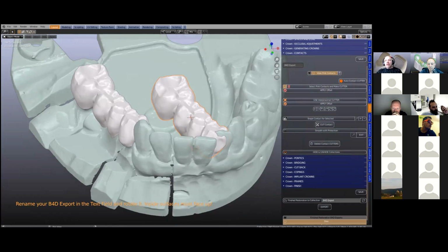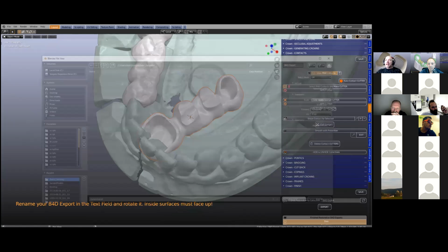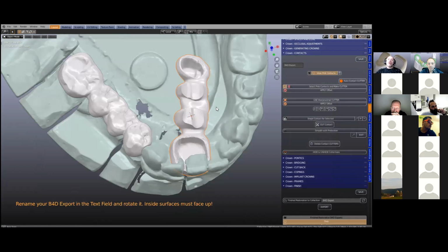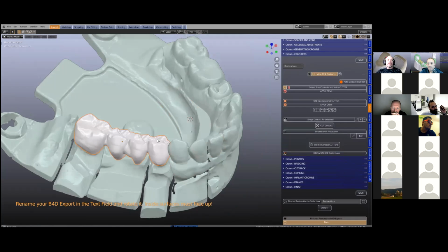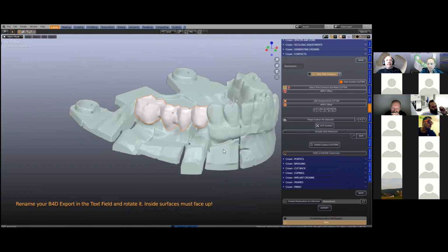Then what we want to do is twist this over face upwards like that, and then we're going to export it. Click the selection only, type in whatever you want to name it, and export, and it's finished. Okay, yeah, Wolfgang, you're quite right, it's a bit sharp. We could have rounded that off as well. Okay, so I think that sort of completes it.